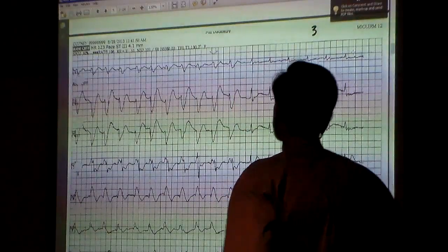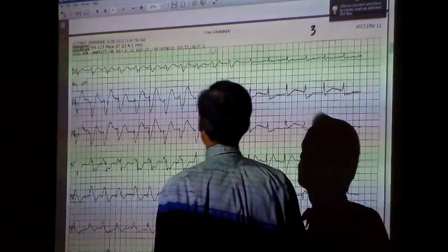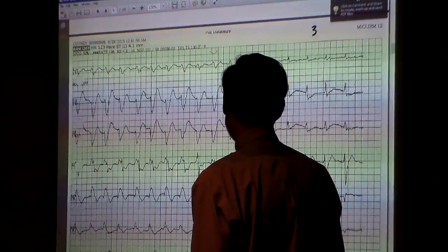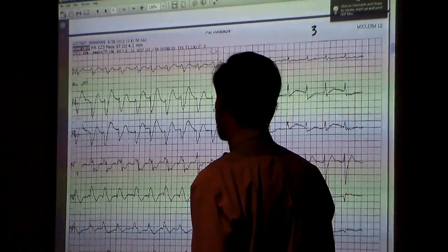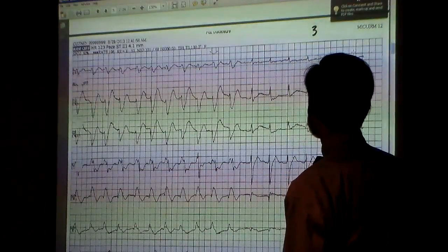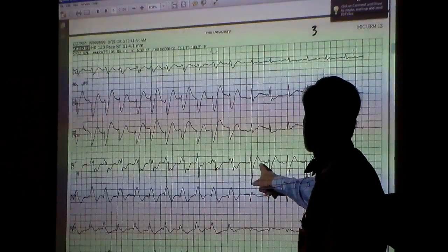So, right, if we look at this, you said it's irregular, and so I agree, it's AFib, right? AFib with aberrant conduction? With a pretty rapid response. But then what happens right here, in the middle of the EKG? QRS is narrowed down. Right, and then what do you see before QRS?